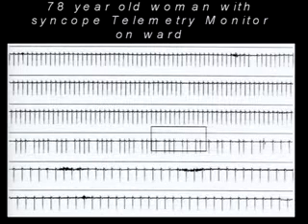So sinus bradycardia can occasionally be, and I have no idea how often, 2 to 1 sinoatrial block. I thought that was a fabulous case. I've never seen a progression quite like that, but I think this is proof. Sure.